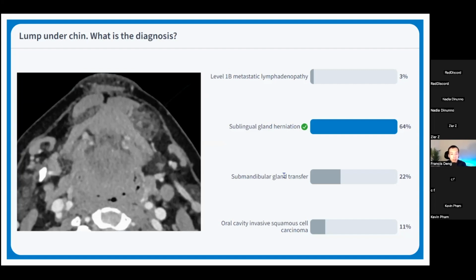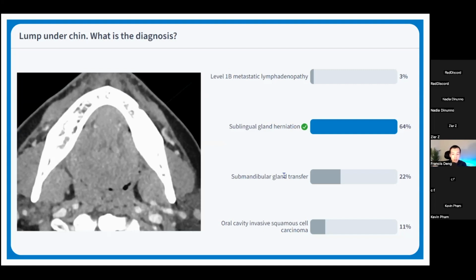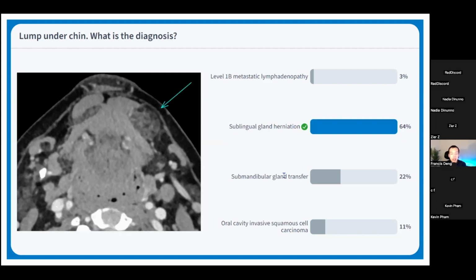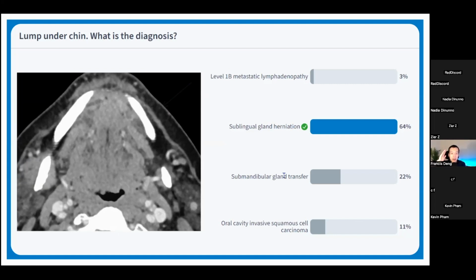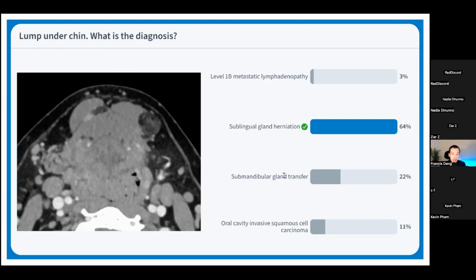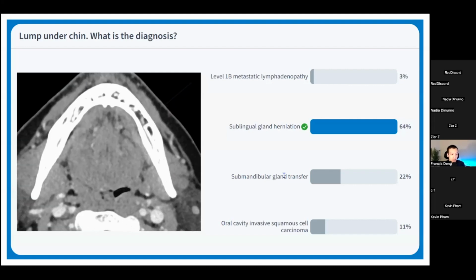So that would have to be the presence of a fluid-filled cystic salivary retention cyst, and it usually goes beyond the posterior edge of the mylohyoid. But I guess you could have the concurrent presence of a ranula and a mylohyoid boutonniere deformity, and the ranula could go through via that boutonniere defect. But in this case, there was not a completely cystic, fluid-filled structure that would indicate a ranula.